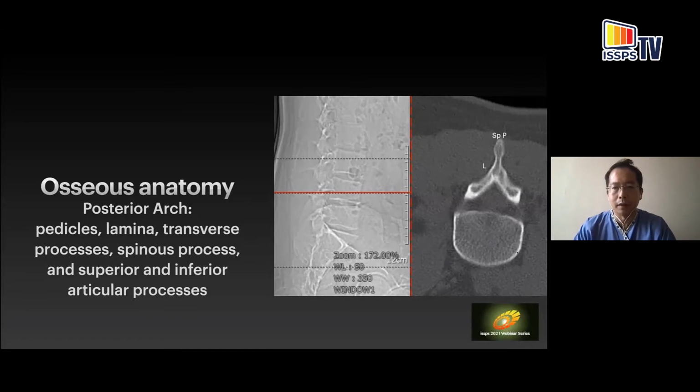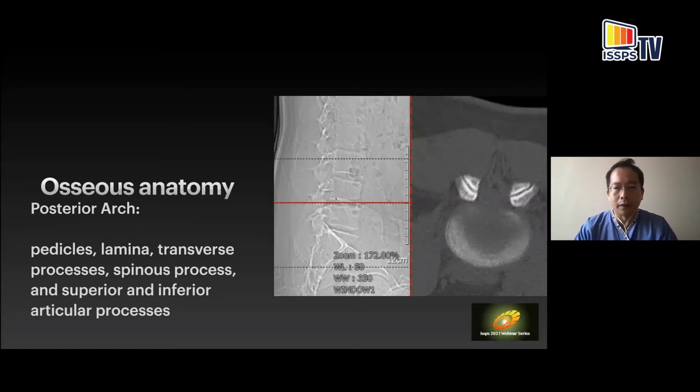That's the vertebral body. Spinous process, lamina. Come down one more level, and then you start to see the appearance of the facet joints. And you are now in the interspinous space. So on the top here, if we follow Dr. Bernard's lecture, this is the supraspinous ligament, and then it flows down into the ligamentum flavum, the two limbs of the ligamentum flavum as they traverse the interlaminar space, and then the facet joints over here, and then the disc level.